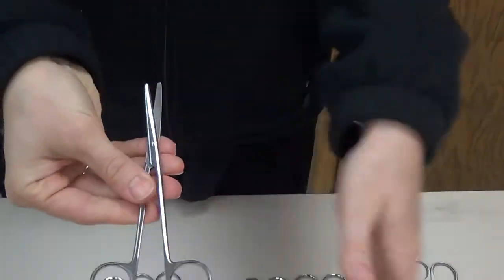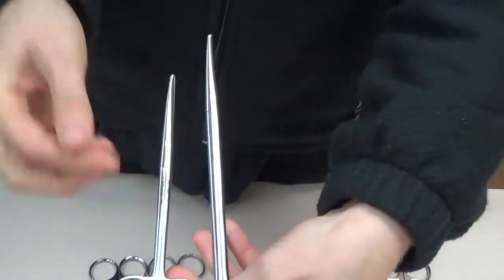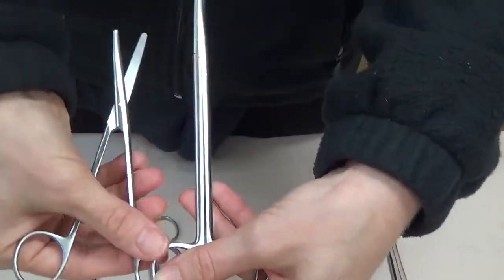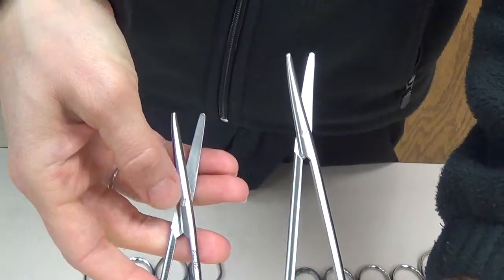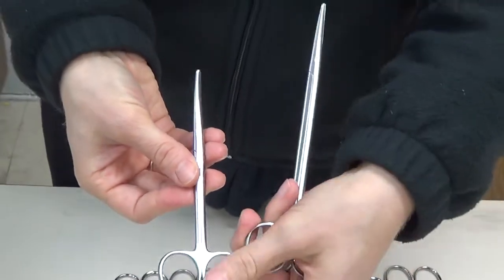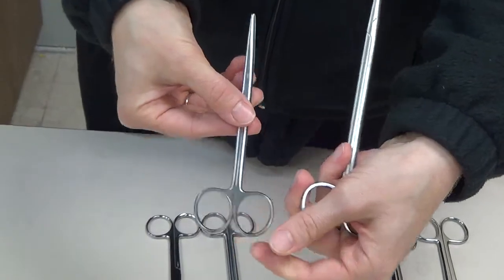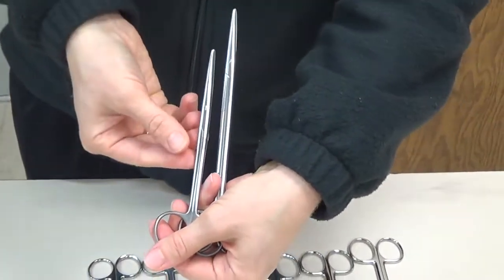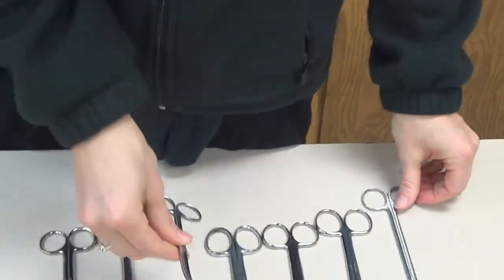Another scissor that we have here is called a Jones. So you can see that the Jones scissor really is just a shorter version of the basic Metz. So the tips look very similar. They again are that fine tip that's going to be utilized for fine dissection. So commonly we would see a Jones used in like a hand case or a foot case, maybe an elbow case. We're going to have fine, delicate tissue that we're going to be dissecting through. The Jones only comes in one length, and it is shorter than the basic Metzenbaum. And of course the tips are going to be curved because we utilize that to cut tissue.